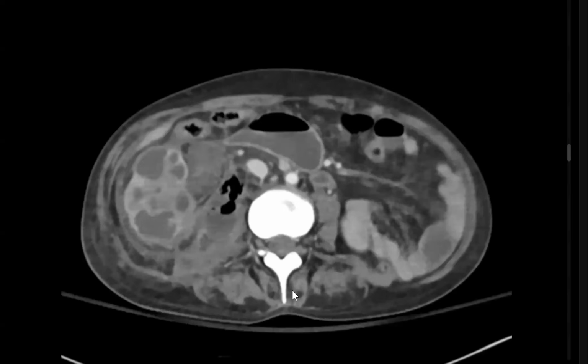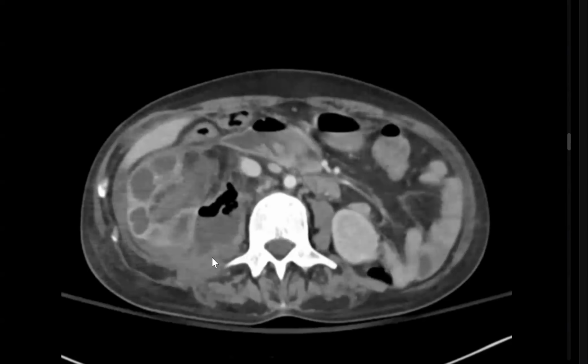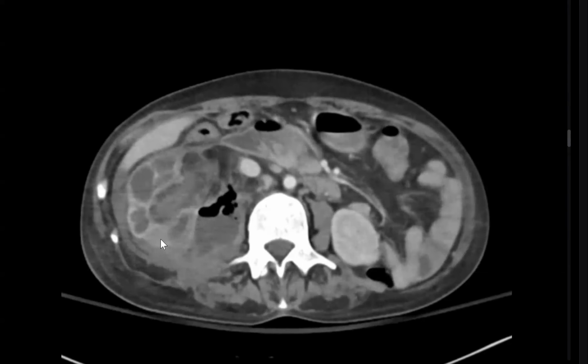But what about the appearance? Collections within the parenchyma. Does it alarm anything, if you have a stone or a calcified structure, long-standing, the parenchyma is expanded, but it contains collections? Xanthogranulomatous pyelonephritis. Yes. Okay.